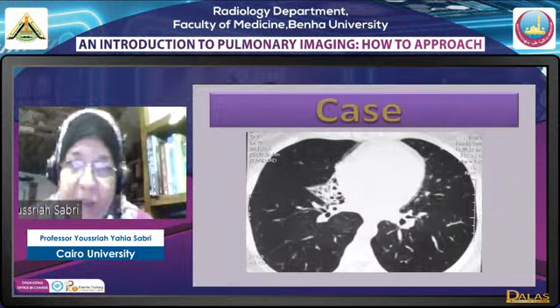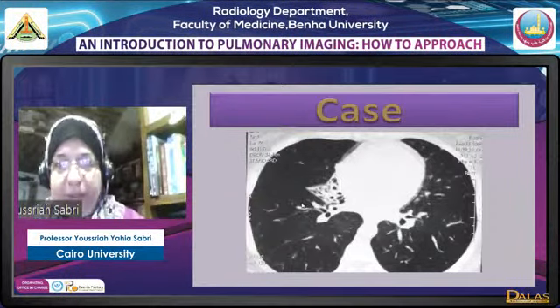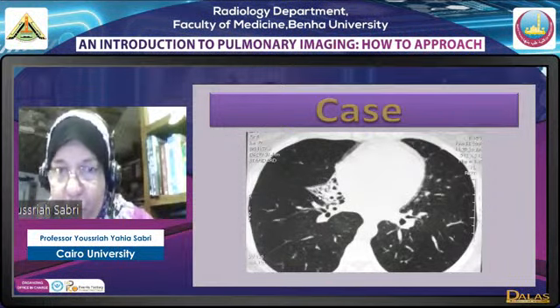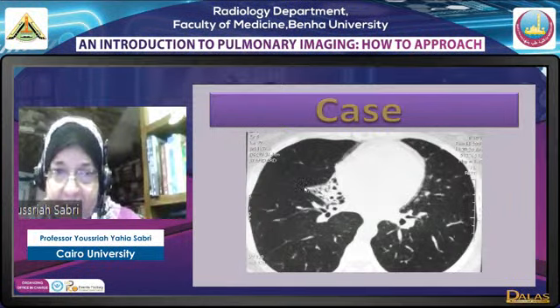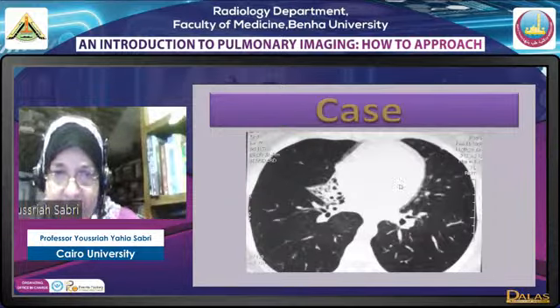So this is a middle lobe lesion with demarcation, meaning that I've reached the fissure, meaning that the whole lobe is affected. Is this a proper site of the fissure? No, it is not, because this fissure has moved toward the lesion. The lesion has regressed in size, and it is demarcated by the minor and major fissures. This is a total cicatricial collapse of the middle lobe in a female 18 years old.